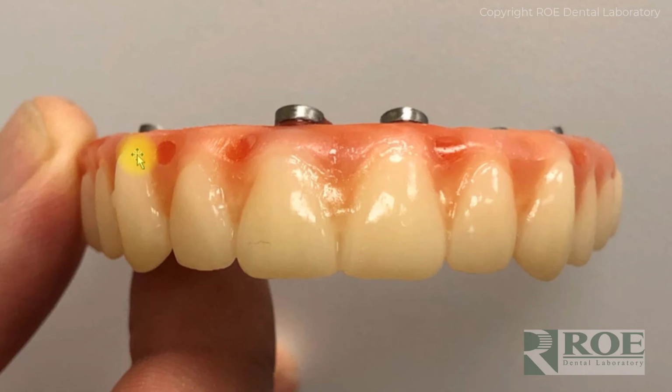However, with CHROME, all of our cases are articulated on conventional articulators. We take the pre-op bite into account. The bite should be on, very, very close to being on. And if the prosthetic is manipulated or moved or floated in at all during surgery to get occlusion right, then occlusion might be wrong, because often patients wake up and they hit in the posterior first. And that is not always a bite issue. That is often a muscular issue. It's often a condylar issue from trauma and from being open for 2, 3, or 4 hours.